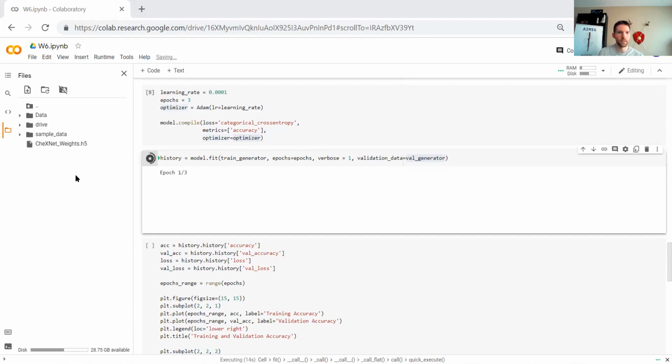And while that's doing that, I'm going to upload my pre-trained file.